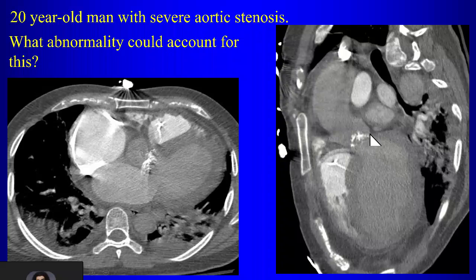Yeah, so first the aortic valve here is calcified. What do you think of the cardiac? Well, look at the lungs. What's wrong with the lungs? Well, what do you think these are? Yeah, there are bilateral pleural effusions. We have some dependent opacities there at the lung bases.